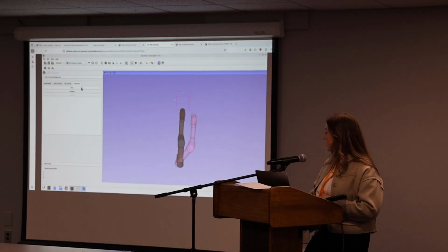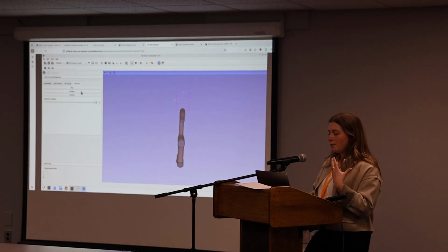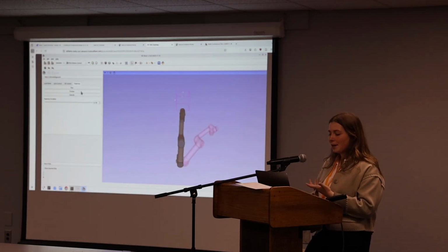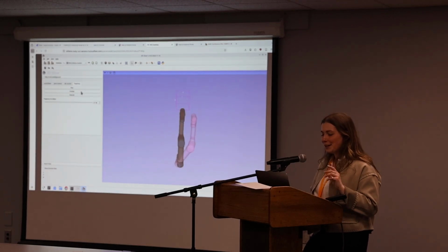This is where the fun stuff comes up. If you do plan, it'll show you that a plan was successful if the trajectory scrubber pops up. You can do preview. This is why I switched to CHOMP, but I guess my motion was a bit weird. That was a kind of insane trajectory. I think that depends on the planner you plug in.